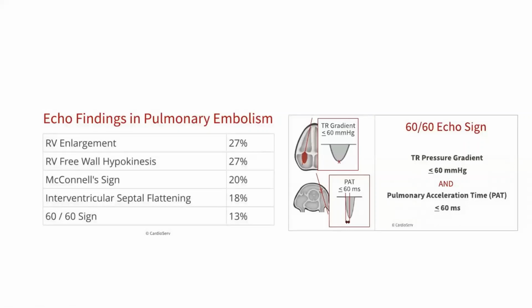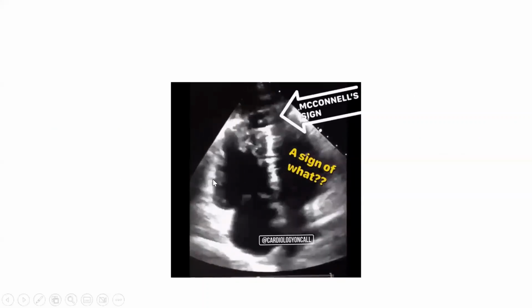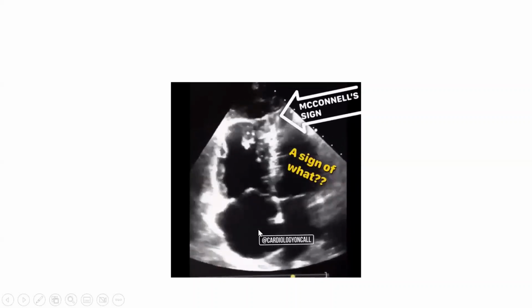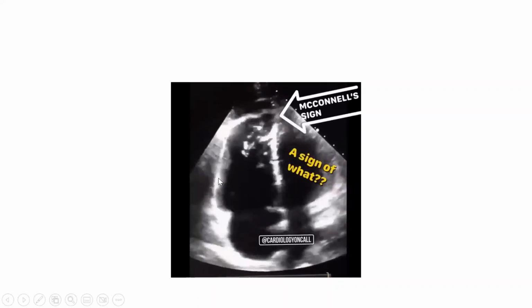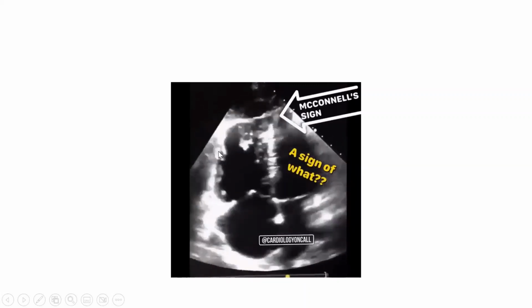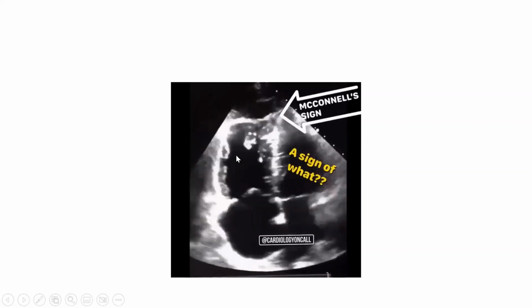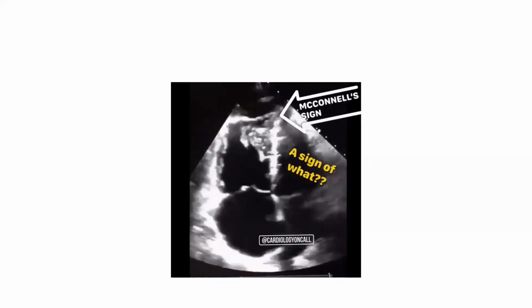Why? Good RV function indicates, exactly, because the TR velocity and the gradient depend on the RV systolic function. So if the RV systolic function is good, you can expect a gradient above 60, which means the RV function is good.